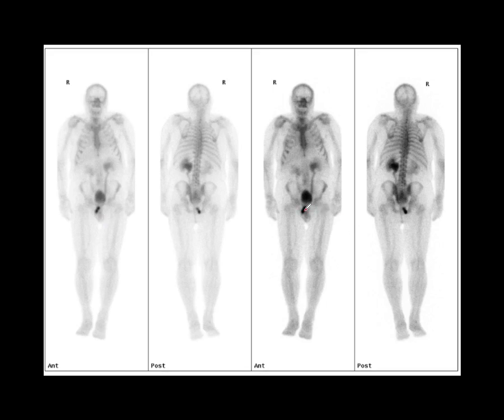The patient does have a bone metastasis, but of course this may not be of immediate consequence. Our patient could have renal failure from bilateral hydronephrosis, so that's something we may wish to report urgently. So keep a lookout for hydronephrosis and bladder outlet obstruction on your scintigram.